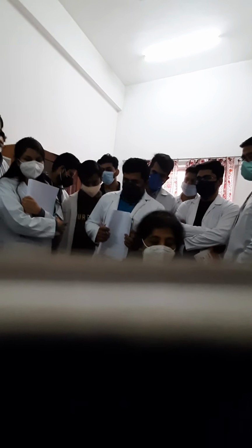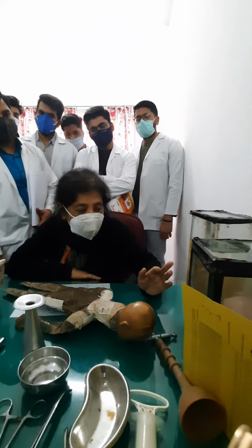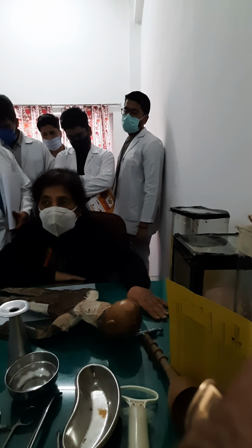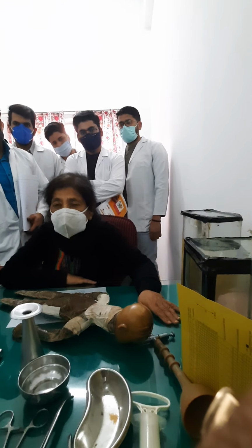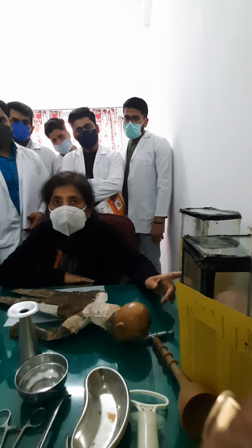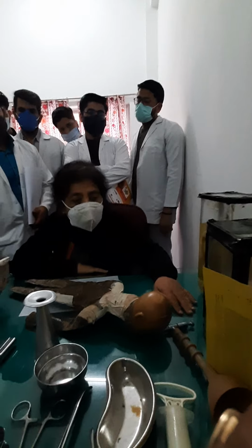Okay, this is for anencephaly because there is no brain and the skull. Huh? What defect is it? Neural tube defect. Which other neural tube defects do you know? Spina bifida, meningocele. And what about hydrocephalus? Is it a neural tube defect? No. Is this compatible with life? No. It stays alive for a few hours, sometimes for a few days. That's all. No. Okay. What is this?